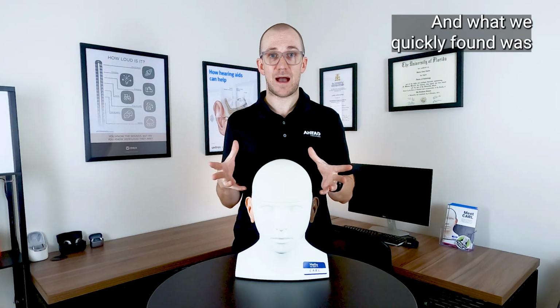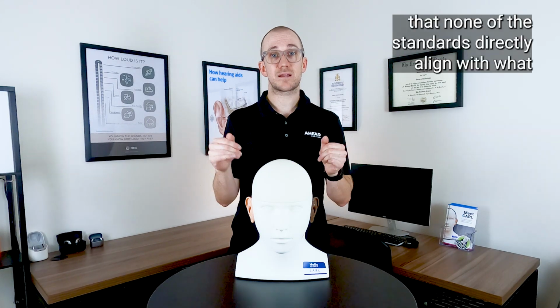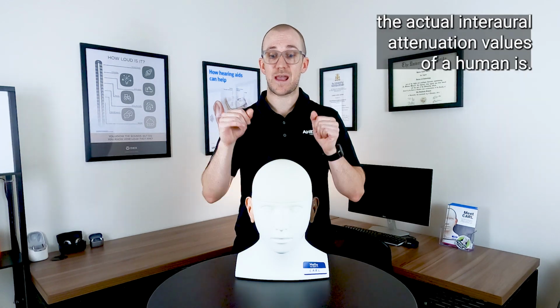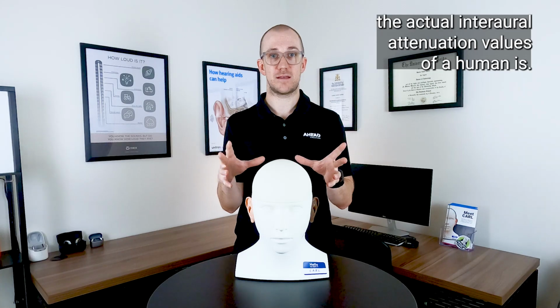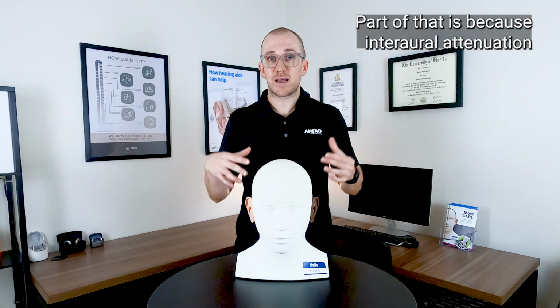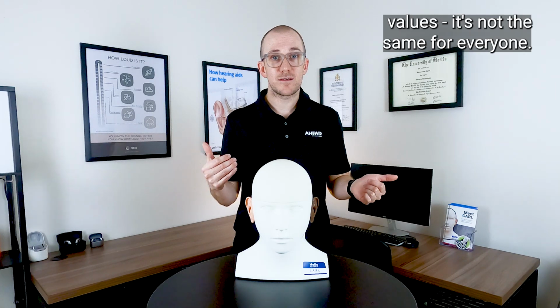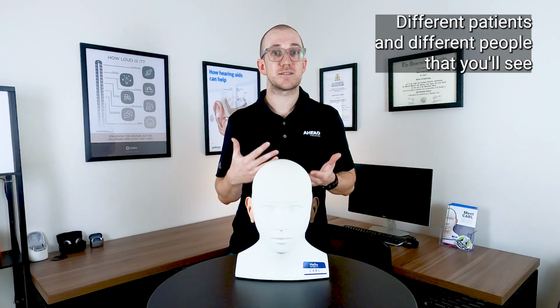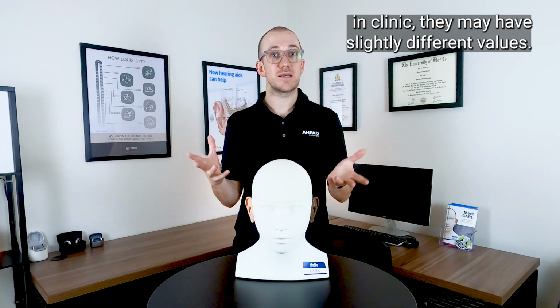And what we quickly found was that none of the standards directly align with what the actual interaural attenuation values of a human are. Part of that is because interaural attenuation values are not the same for everyone. Different patients and different people that you'll see in clinic may have slightly different values.